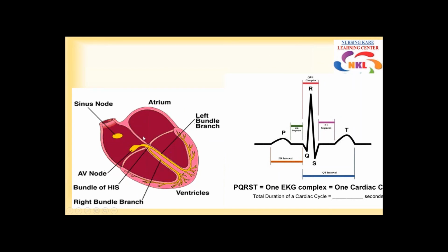And so here in this diagram of the heart, we're actually seeing how the electric current is sent through our heart from the SA node over to the left side of the atrium, and then is conducted through the bundle of His and then comes up on the Purkinje fiber on this area. Now, with each contraction of the heart, it is mimicked. That's what we're looking at on the EKG.